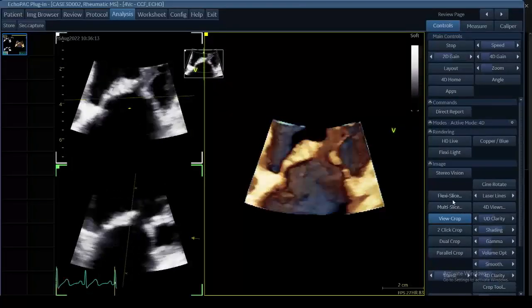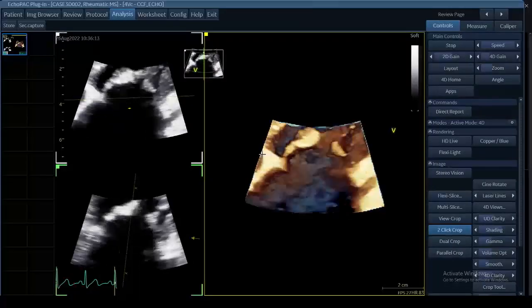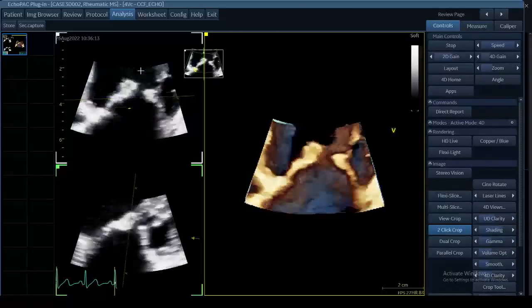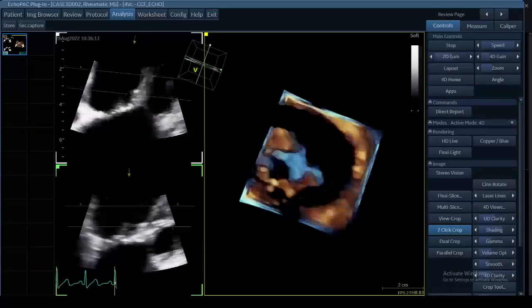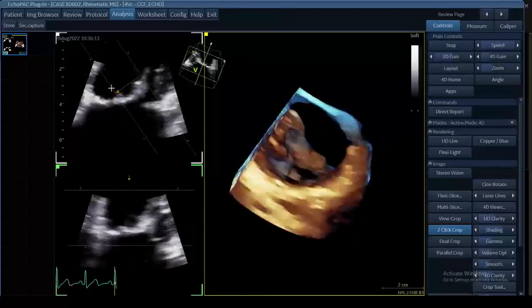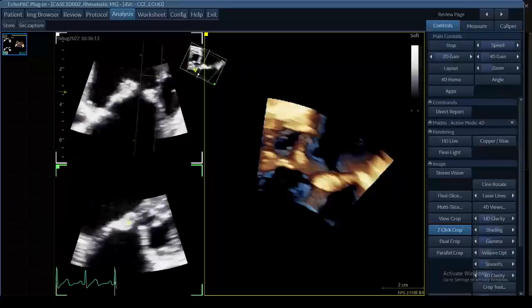And so to do that, if you go over to the right, you'll see a button called 2-click crop. If you click on that, then the next step is you can come over to your images on the left, and the first time you click the mouse is going to be where you want your eyes to be. And then you'll see that arrow. That arrow is basically pointing, saying this is where I want to look. If you drag your arrow this way, you see how the image over on the right-hand side is changing depending on where I'm looking.